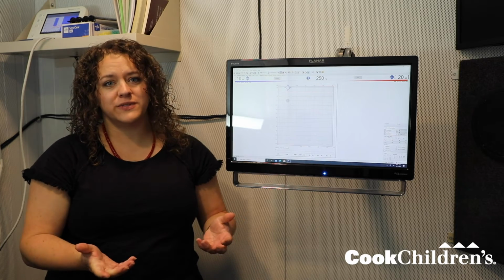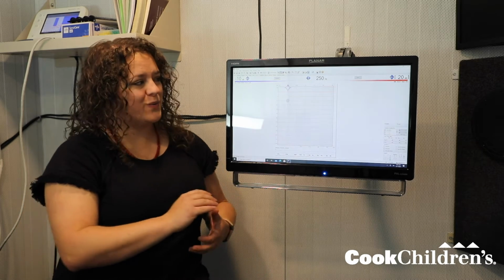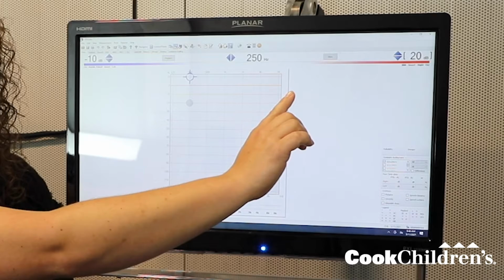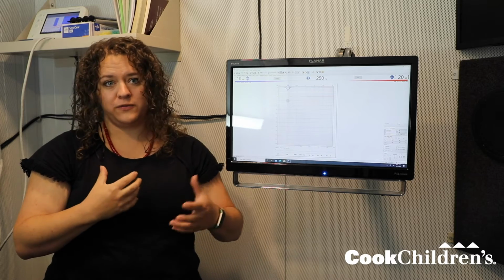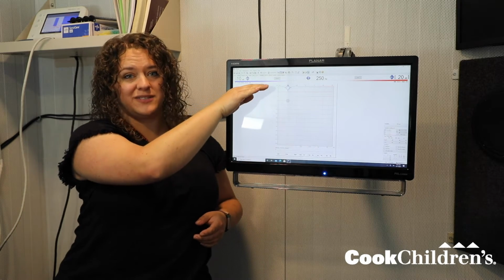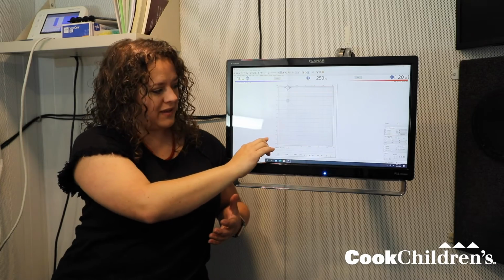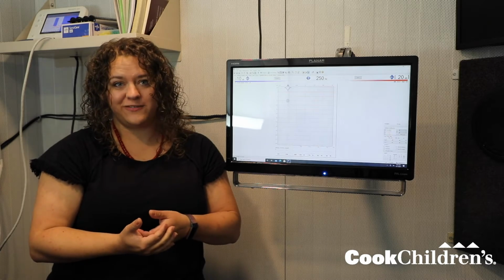It can be kind of confusing to read because it's upside down from a normal graph. So when you look at this, on the far left side is low bass pitches, and all the way over on the right side is high squeaky pitches, like a mouse or a flute, something like that. At the top is the softest sounds that anyone can hear. All the way down to the bottom is the loudest sound that we measure. So hearing at the very bottom of the graph is equivalent to an airplane taking off nearby.